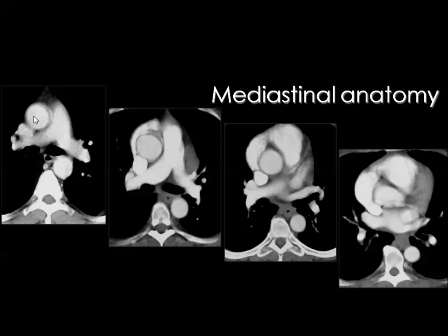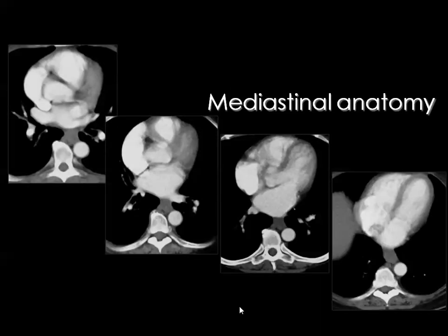The ascending aorta will enter the left ventricle. This is the ascending aorta, and this is the left ventricle, adjacent to the right ventricle, adjacent to the right atrium. And this is finally the left atrium, which is a midline cardiac chamber anterior to the spine. And here you can see the four chambers of the heart. This is the left atrium and right atrium. This is the right ventricle and left ventricle. And finally, you have reached the diaphragm and the dome of the liver.